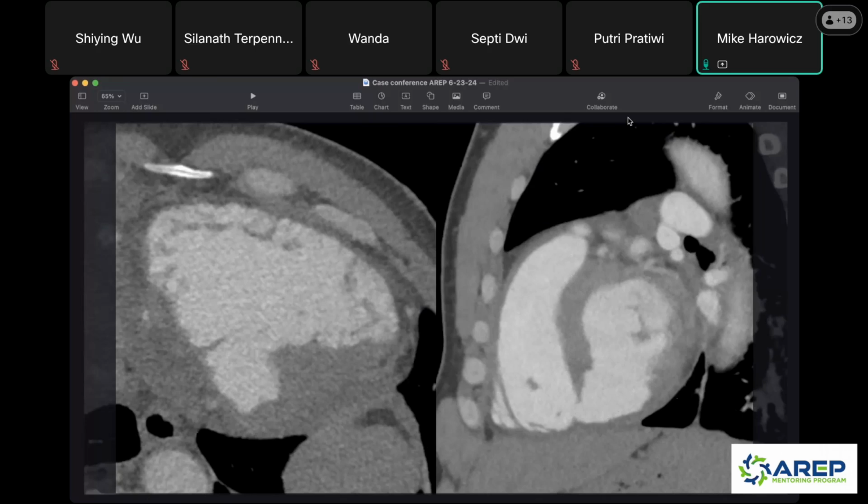So what's going on here in this patient who has acute onset shortness of breath? They had a myocardial infarction a few weeks ago, maybe 4 or 5 weeks ago, and now they're showing up with this. Well, this is actually a post-infarct ventricular septal defect. So you can get this sometimes, right? So if you have a myocardial infarction, you cut off the blood supply to that tissue. That tissue now is weakened. It's probably going to undergo some remodeling. It's probably going to undergo necrosis and some fibrous tissue that's going to be deposited if you don't presumably restore the blood flow to it.